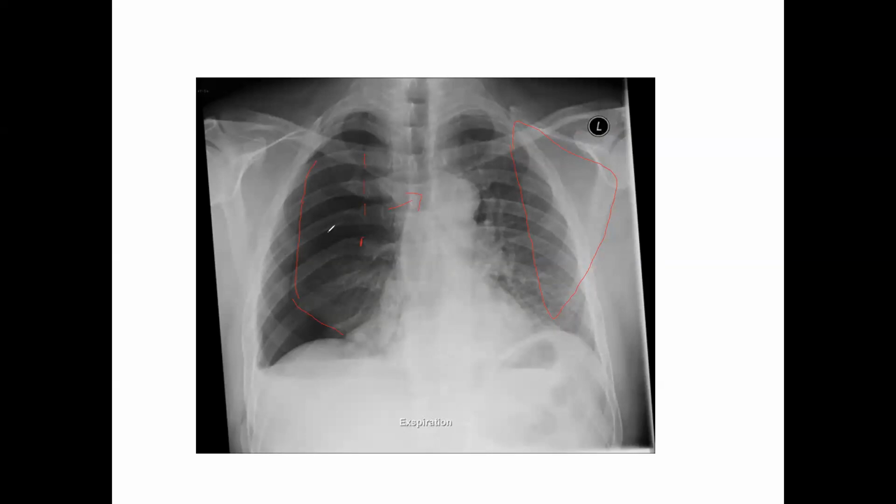So if we look over here, if we had double breaks on adjacent ribs, then you would likely see, as you've read about in books, the paradoxical movement of the chest or paradoxical chest movement. That would be due to your double breaks in the adjacent ribs. But so far, all I'm able to see is some individual breaks that are pictured over here. So let me clear this and we'll move on to the next one.